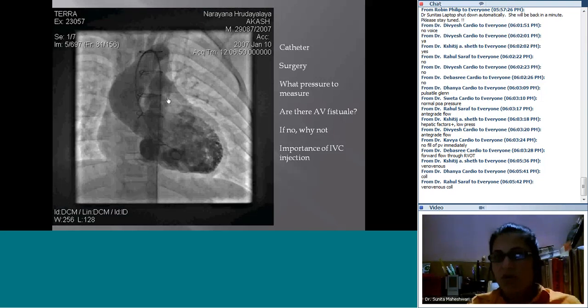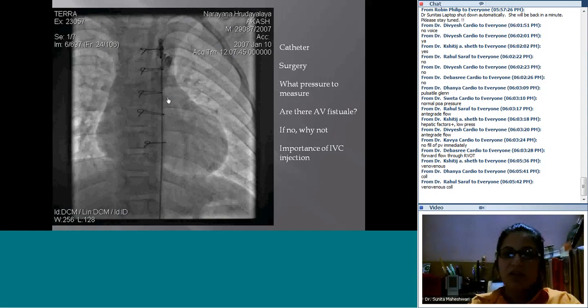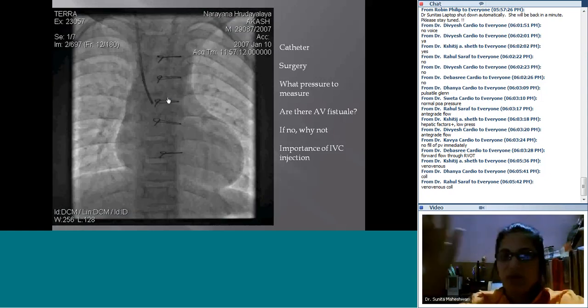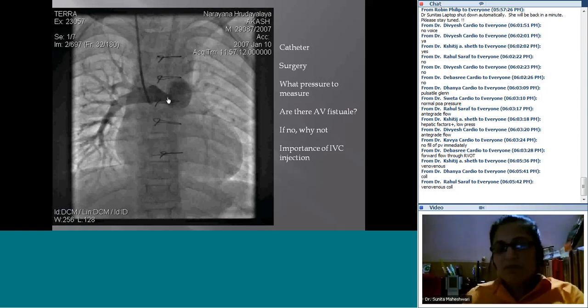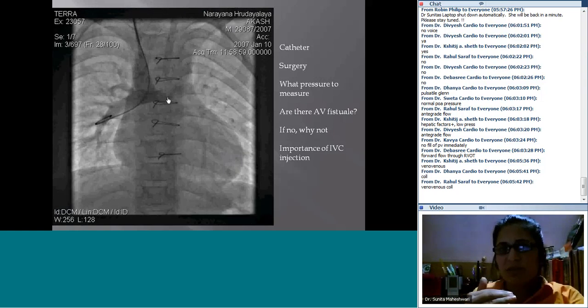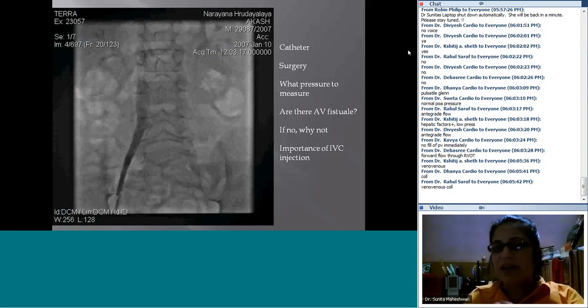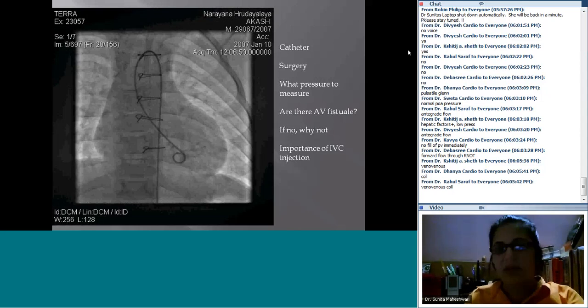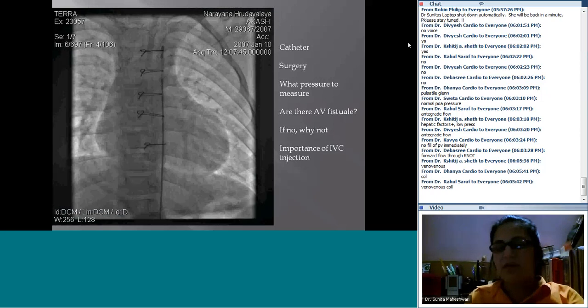Veno-venous collateral, on the other hand, would be if something opened up from the SVC and filled the IVC system. And that would be seen when you have high pressure. So when it's a low pressure system, it's unlikely to get veno-venous collateral, but it does not affect the formation of AV fistulae. In fact, let me ask you this question. When you have AV fistulae, what pressure do you expect in the pulmonary artery system? 5 of 20. You get actually a very low pressure, that's right.